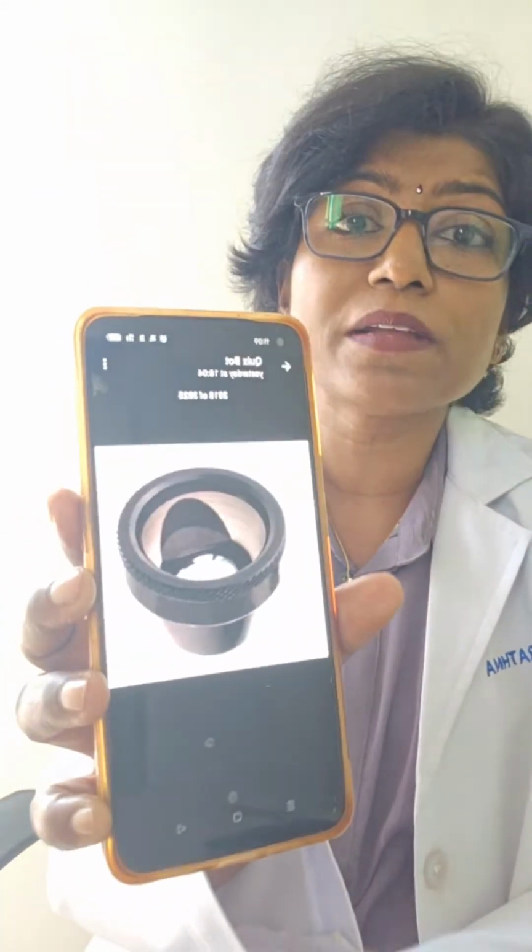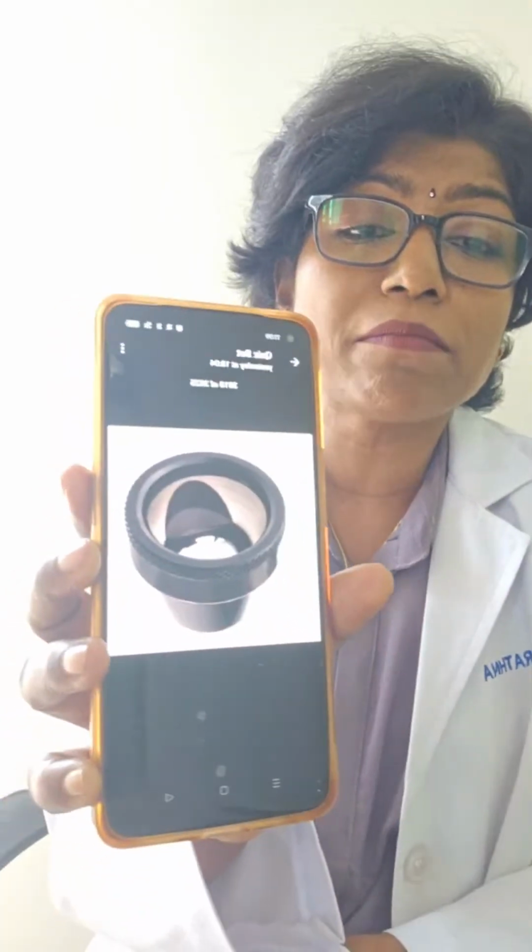Option D, KF ring. Kayser-Fleischer ring, to see a very, very early KF ring, the most sensitive thing is a gonioscope. You can see the very early deposits of copper on Descemet's membrane. You can see it on gonioscope. So this instrument, this Goldmann's gonioscope, to be very specific, one mirror gonioscope, cannot be used to see corneal nerves.